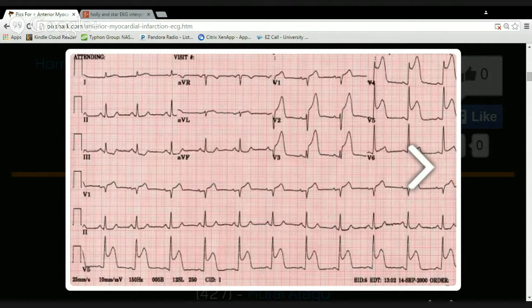There is ST elevation slightly in V1 and V6, and severely in V2, V3, V4, V5. This tells me that there is an anterior acute ischemia that involves the LAD. There is no pathological Q waves evidence, no necrosis.